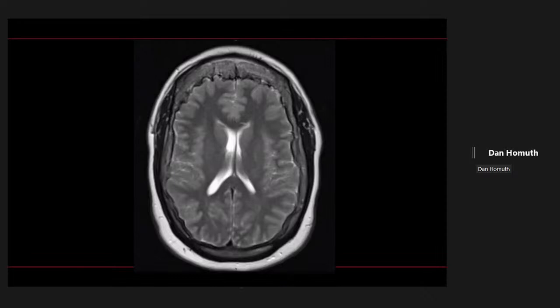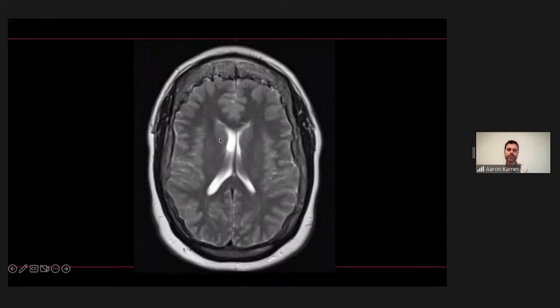I feel like there's a few areas, like maybe the right insular cortex looks a little bit thickened to me, and there's some asymmetry between the lateral ventricles, and the caudate nucleus has a little bit of a lumpy bumpy appearance, and then as you scroll through it looked a little less abnormal, given just the constellation of images.